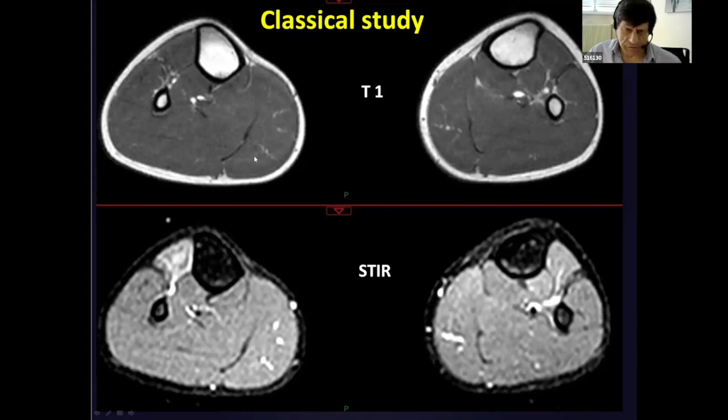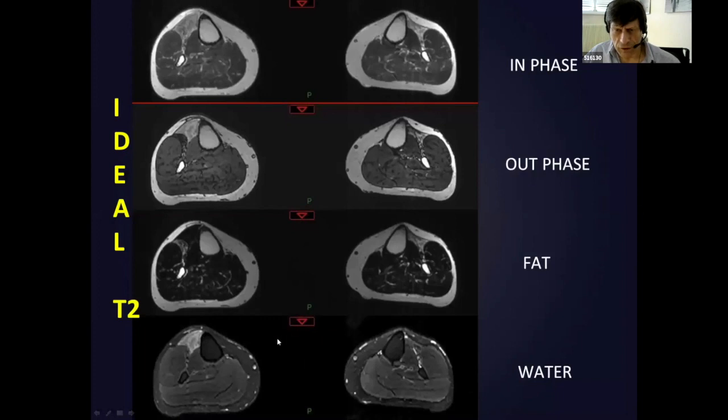These slices are performed at the same level, and this patient has FSHD disease in early stage of inflammation of the tibialis anterior, previous to fatty infiltration. Another patient with facioscapulohumeral dystrophy, but in a late stage.